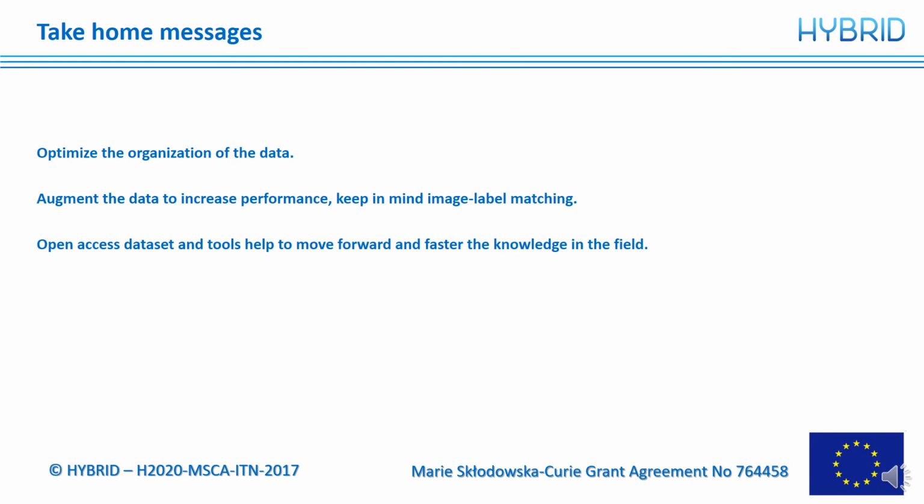The second thing is the augmentation. As we saw in the results, the augmentation helps us to increase the performance, but we have to keep in mind to preserve the image-mask matching, as we saw with the rotations, and also the time that this augmentation adds to the training process.